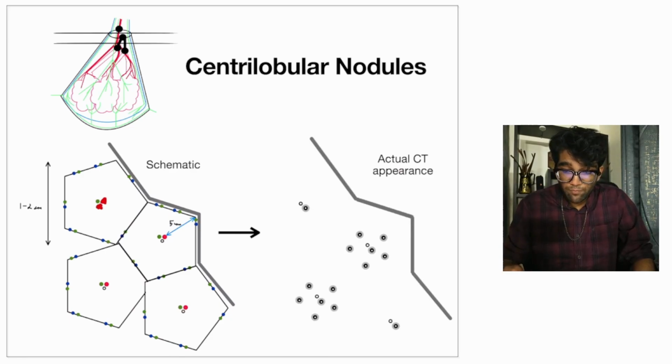So what I end up getting is I can now visualize the bronchioles within the pulmonary parenchyma. Okay, so here, or I could even visualize the branch pulmonary artery distally. So those are symmetrically placed around this central structure, so they are actually branching like this, and distally there is also an opacity. So this pattern is what we call a centrilobular pattern.